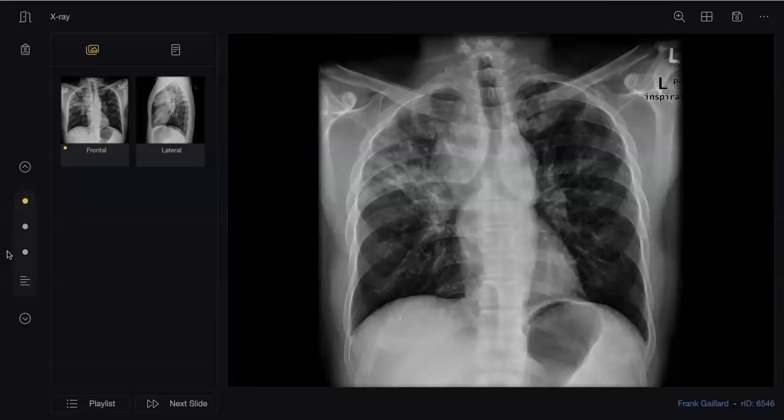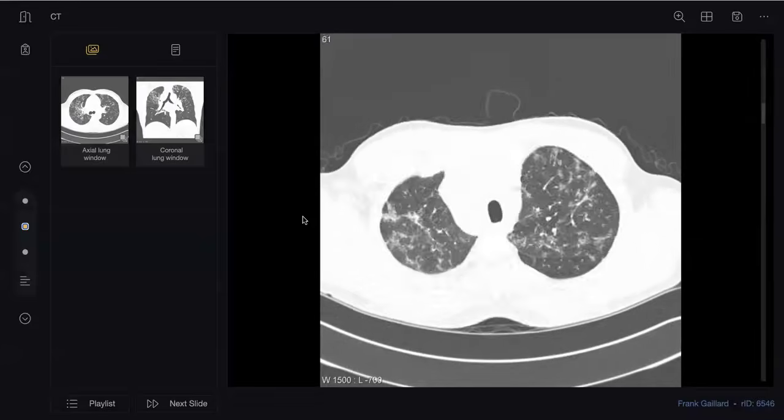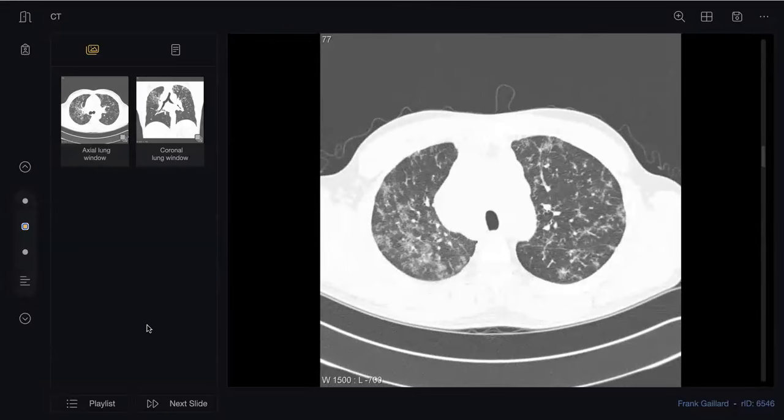What is the distribution of nodules in sarcoidosis? Just look at the CT scan and tell me. In the mid zone. No, I'm not talking about mid zone, upper zone. Which kind of distribution do the nodules show? Are they centrilobular or something else? It is a diffuse distribution, peribronchial. Yes, peribronchovascular. We call it perilymphatic, in which you see nodules along the fissures and in subpleural spaces, predominantly in the mid zone.